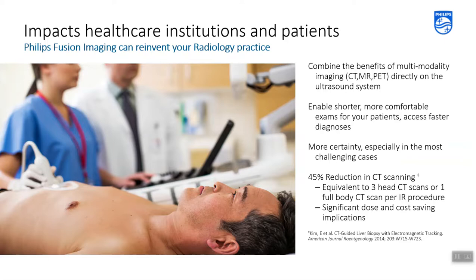You can also use contrast enhanced ultrasound in combination with fusion. The main advantage is that by using fusion imaging, we can identify the exact location of the lesion on ultrasound before we inject the contrast media.